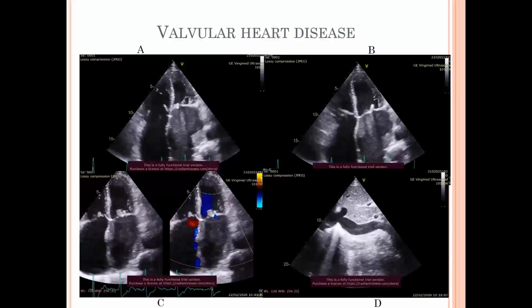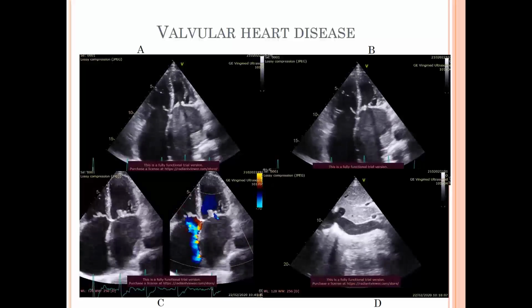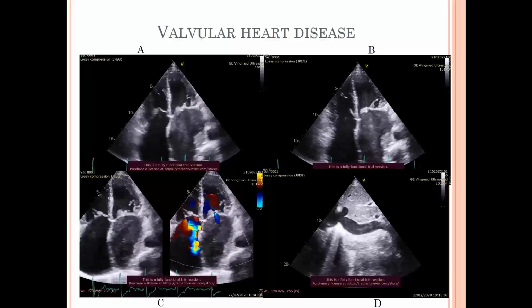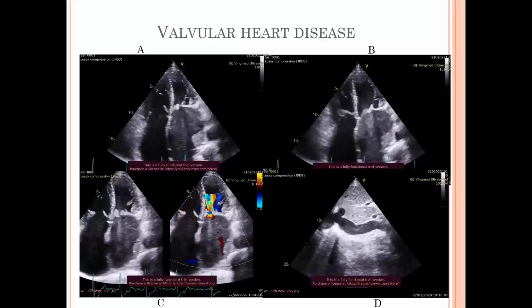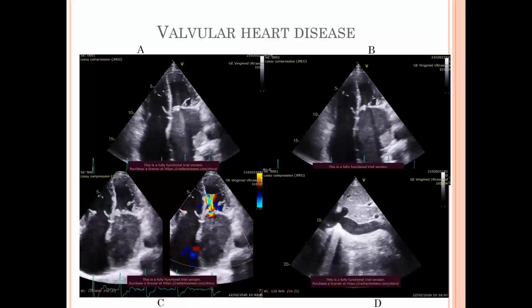The left atrium shows heavy spontaneous echo contrast, and on the left atrial free wall we can see the organized thrombus over there from this cut as well. The ankylosed posterior leaflet, markedly restricted anterior mitral leaflet. There is paradoxical septal motion of the septum.